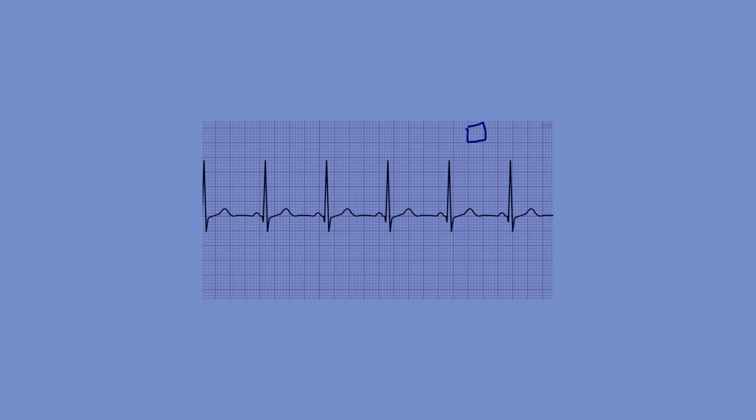The first way is probably my favorite, because when you're just looking at an ECG, not for exam's sake, you just want to get to the answer as quickly as possible. So what you do is you take one R wave here and one R wave here. As we know, QRS means when the ventricles beat, so between 1 R and 2 Rs is 2 beats. So we calculate the difference between these two. For this ECG, you can see it's 1, 2, 3, and then we've got half here and half there. So that for me is 4 big squares.